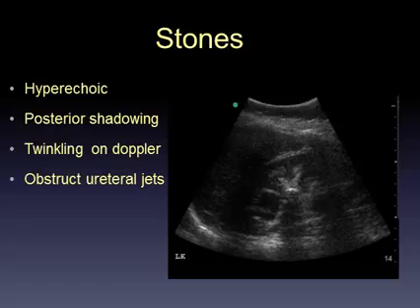And what can cause hydronephrosis? That's right, stones can cause hydronephrosis. Fortunately for us, however, as their name suggests, stones are made from hard mineral substances and are hyperechoic. They reflect sound waves, showing as bright white on the scan, and exhibiting some posterior shadowing, and I would encourage you to look for that shadowing in the first instance, as there can be other connective tissues within the kidney that also shows as bright white, but will not have shadowing.